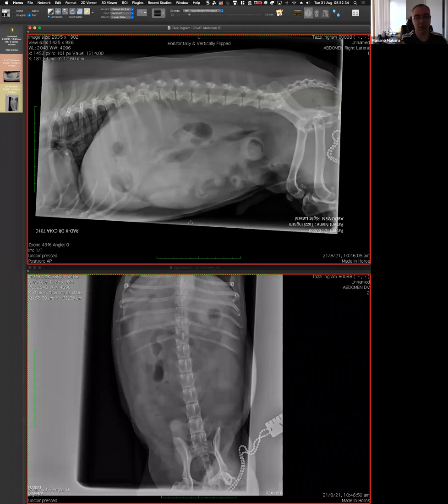Makes sense? So you have a vomiting dog, that for me is the trigger, is solving the problem. And then in that, I can easily find the detail. My weakness is probably in a vomiting dog, where we see this: have I checked all the vertebrae to see if there is a met? Have I checked all the ribs? Have I checked the lung to see if there is a met? Is that important? That's very important. Because one thing is to send this dog to surgery because it's a foreign body, but this is a 10-year-old dog. So is there anything else that is going to change the overall approach? And it's in front of my eyes.